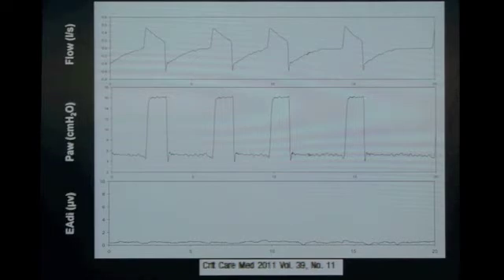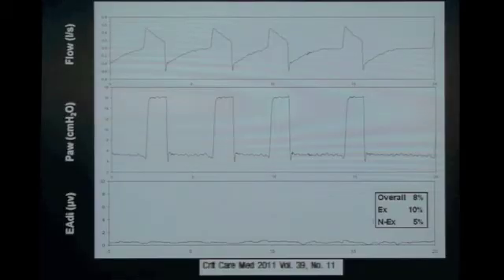Also, it's not easy to recognize auto-triggering. And you know, with the upper tracing, it's really very, very difficult. And indeed, only 8%, which is 10% of experts and 5% of non-experts, were able to recognize the asynchrony in this tracing. But I did not want to cover the last one, so anyone can believe I'm among the good ones.